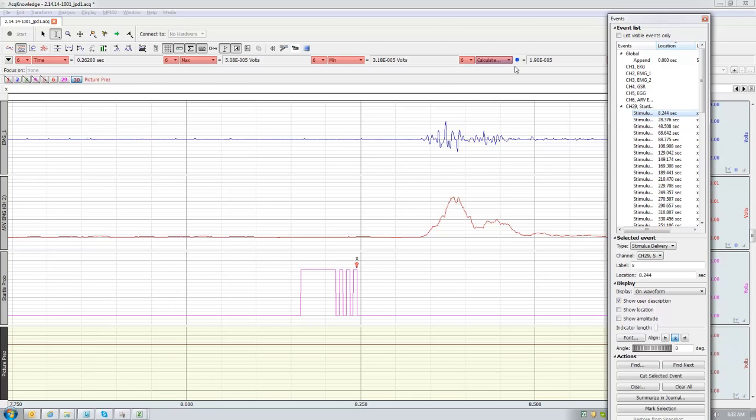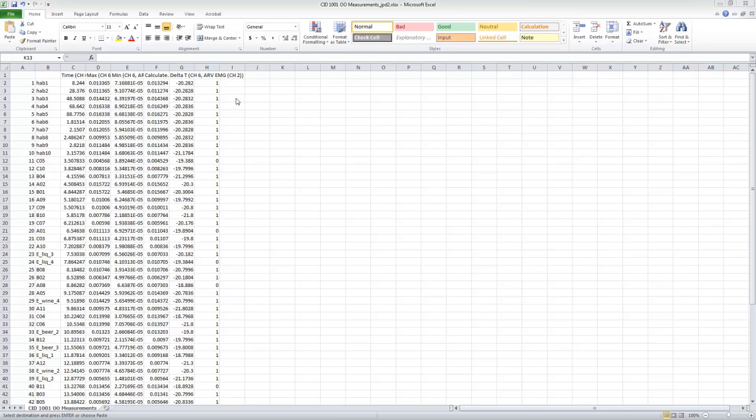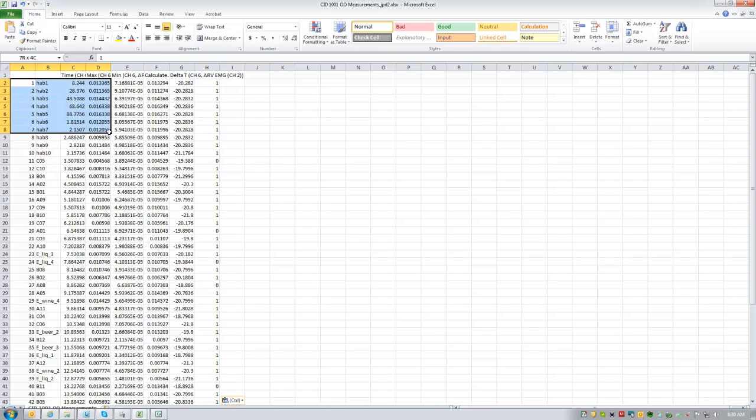Okay, in this next step, we're going to start to analyze all of our startle values individually. The first thing we need to be aware of is we don't necessarily even need to look at the habituation trials. We're not going to be using any of this data. This is only to bring their tonic startle level to a reasonable level that won't modulate from just its tonic element. And we're going to start with startle trial 1. I'm going to show you some different types of startle values and whether or not we need to eliminate them or they could be problematic.